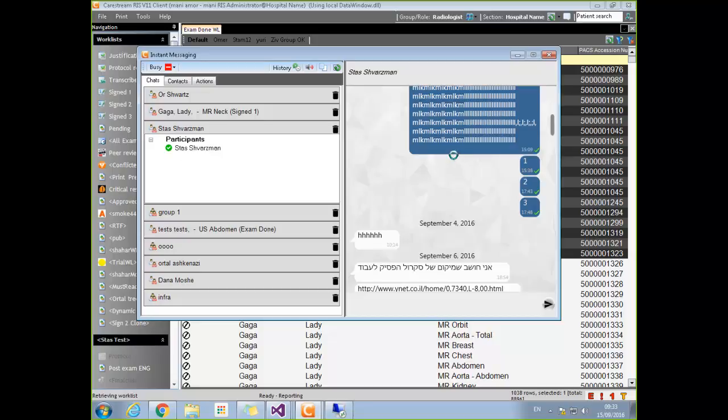It's supposed to be documented. I have a note down about the ports as well. That will come out with the documentation. Installation wise, it will be installed by the installer. The server side portions and the client are built in, it's just there. But there is a permission where you can turn chat on or off.